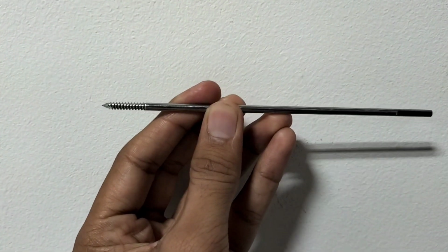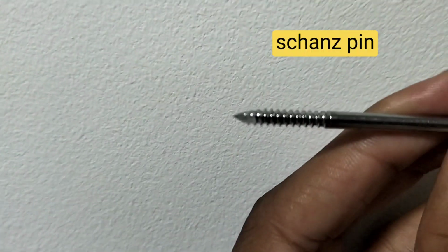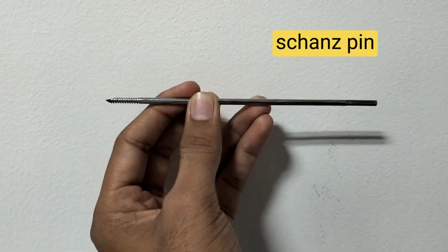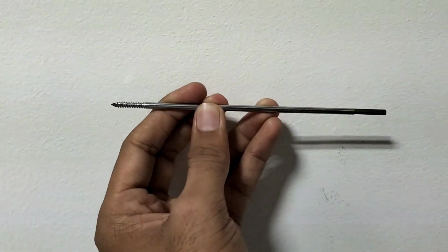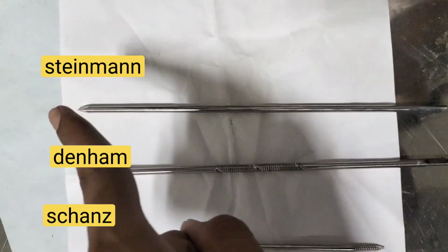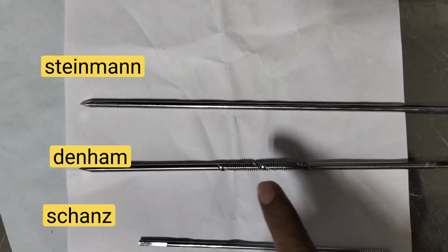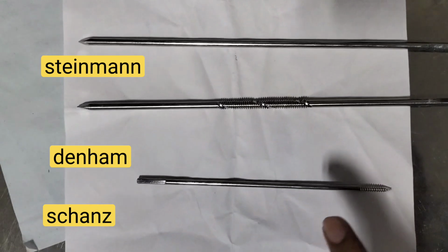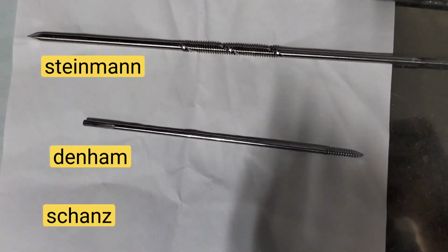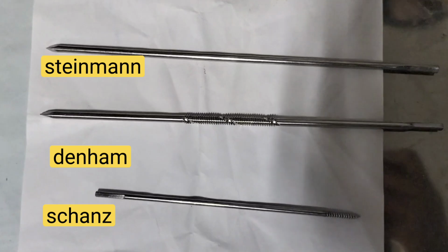So here is a third pin. At one end it is pointed and has threads, and the other end is blunt. This is Schanz pin. It is also used for skeletal traction. So here are the three pins. If there are no threads and one end is pointed, it is Steinmann, and if there are threads at the center, it is Denham's, and if one end is threaded and sharp and the other end is blunt, it is Schanz pin. These are the three pins.